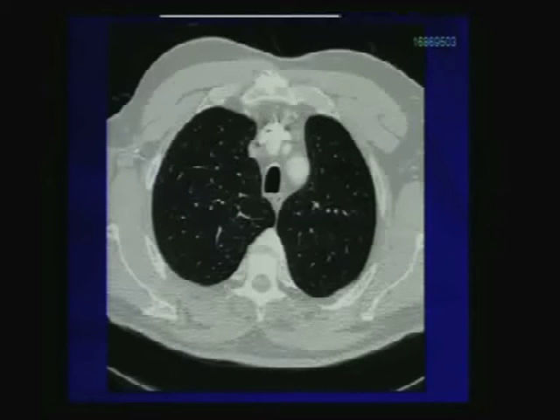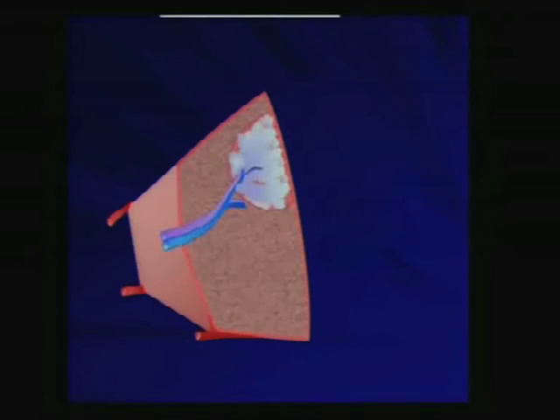And this is what we see in a live patient, those very small areas. We realize also that those black areas are not really defined by a well-defined wall within those areas of decreased attenuation.